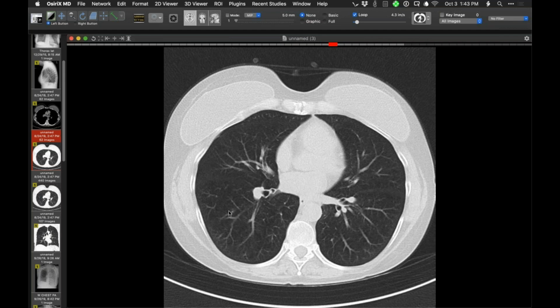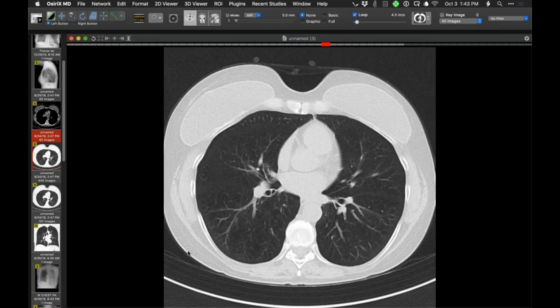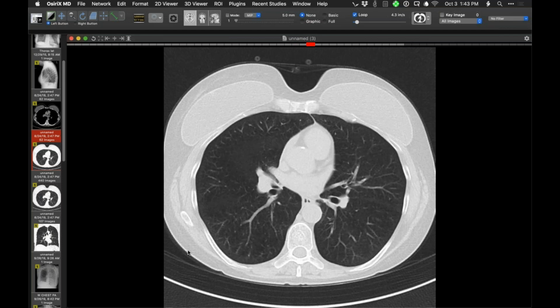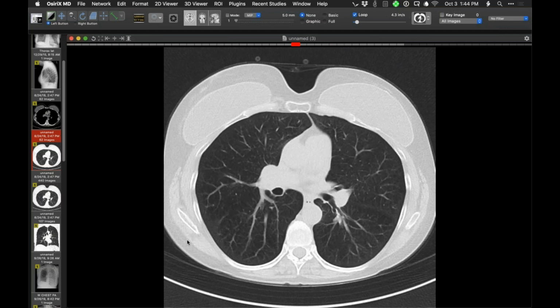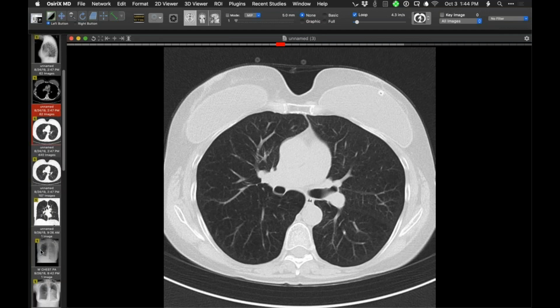And you can look at that on thin sections. But if the interlobar fissures are incomplete, particularly if they're substantially incomplete, they may deem that person not suitable for the transbronchoscopic lung volume reduction surgery because airflow will just go from the other lobes into the upper lung zones. But she was deemed a candidate, and they did the procedure.